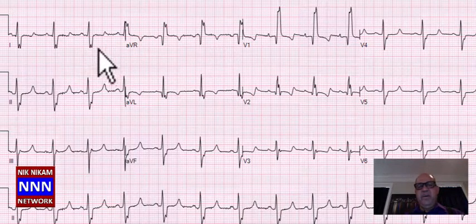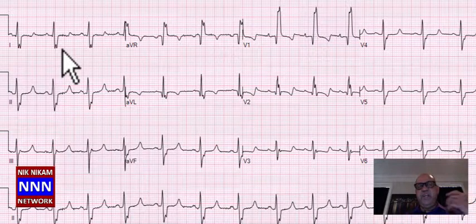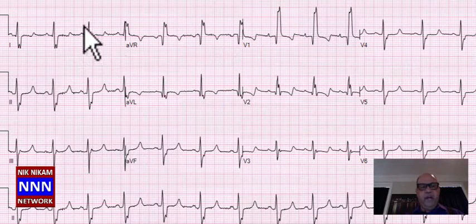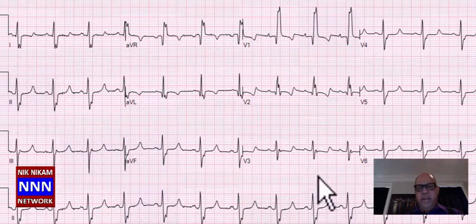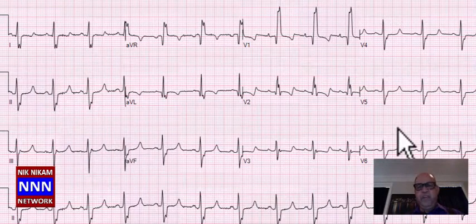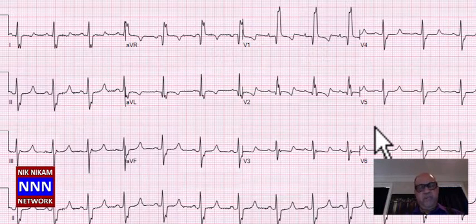But as I said, the moment you pull up an electrocardiogram, you need to start making diagnosis. You have to establish the rhythm, you establish the axis, you look at the regions, high anterior, inferior, anterior, and lateral. There are only four regions that you need to be focusing on, because these are the four major branches that we can deal with coronary angioplasty, percutaneous intervention, or coronary stent placement or bypass surgery. So that's how you practically approach a patient's existing medical problem.